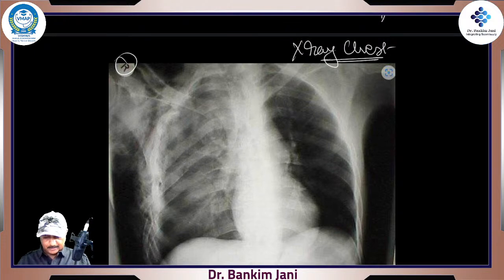Achha, what was I talking about? Yes, look at the lungs. The left side of the lung looks normal, because after watching a few X-rays you can visually say, okay, this is normal. However, on the opposite side, the right side, there is less blackness. When the blackness is less, that means air is less. If the air is less, that airspace has been taken over by something. This is more whitish, and it is quite irregular.